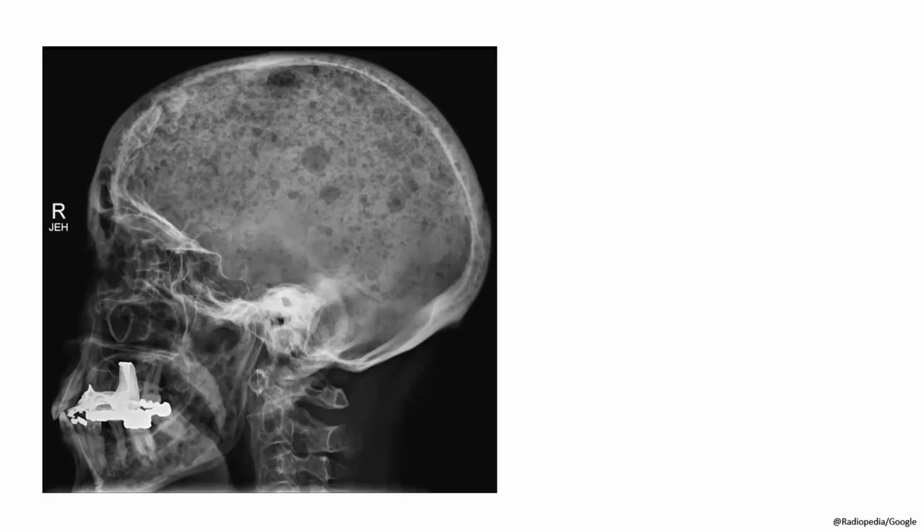What is this appearance? This is a skull radiograph lateral view, which is showing raindrop skull appearance, which is because of calvarial multiple myeloma.